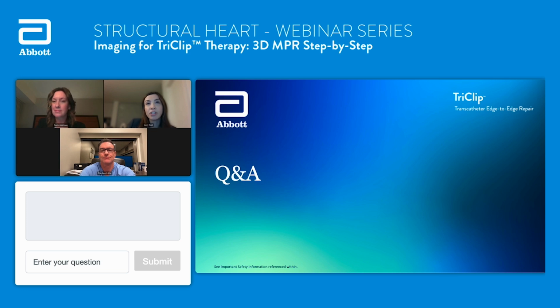I think that's a great question. I wouldn't say that it's more ideal. I would say that the best or the most ideal MPR should be built on whatever you have the best 2D for, whether it's mid-esophageal or distal esophageal or transgastric. Routinely, I find that most of the procedure is done in the mid or distal esophageal, so it's really easy to then just build your MPR in that view. But if you don't have a good mid or distal esophageal view, then you can certainly build your MPR from the transgastric and do the procedure using that image.